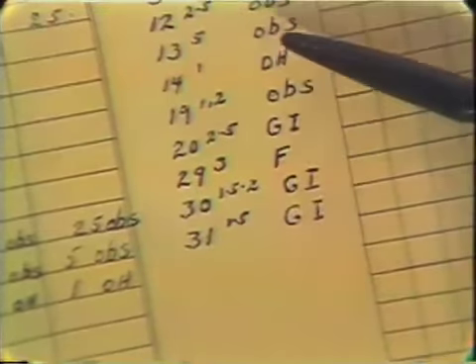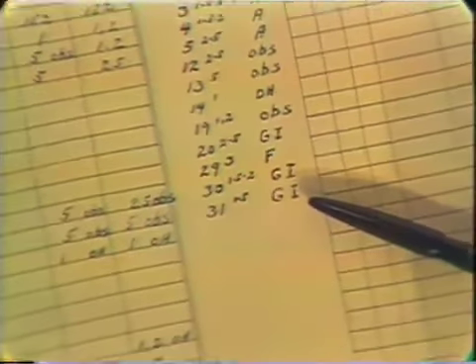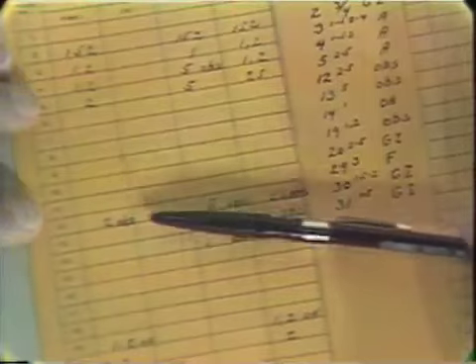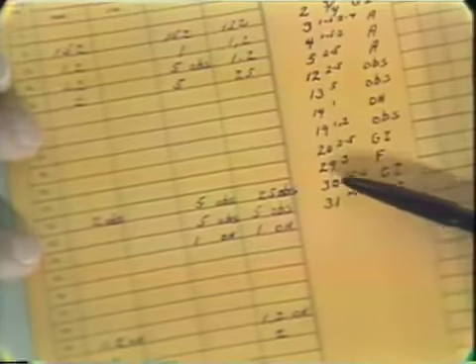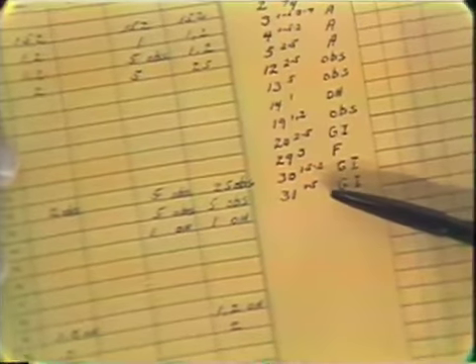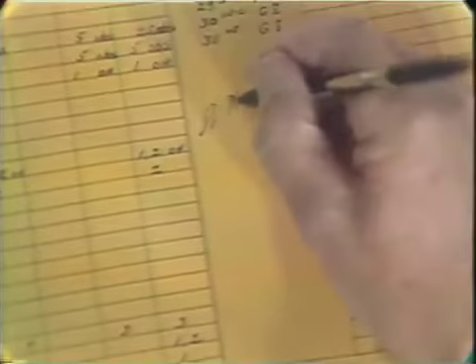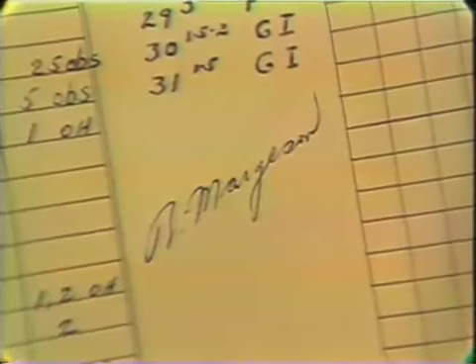After this tentative treatment plan is established, the student should call an instructor. He will check through the entire series of findings, the radiographic findings, oral findings in the mouth, and either agree with your treatment plan or make suggestions or alterations to this treatment plan. When that is completed, the instructor will sign across this column, and you are free to make your final treatment plan entries.